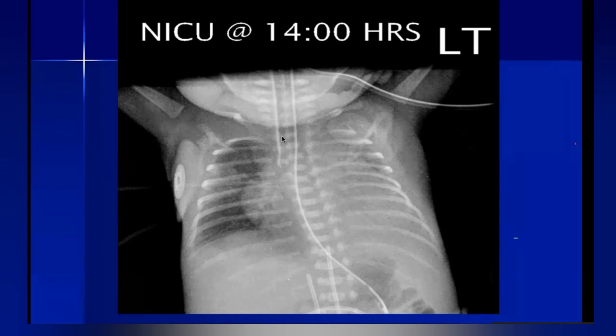Very clear. It's very easy because the ETT is low and the right main bronchus is straight, not like the left. Sir, because it is moved downward. Yeah, that's because the ETT is low, just as you mentioned, just above the carina, and we have to adjust the ETT. And also they may need to put the patient on the left side down to allow the surfactant solution or therapy to go to the dependent lung. So that's one of the tactics that a neonatologist may use: to change the position of the baby to allow the surfactant to fairly distribute through both lungs.